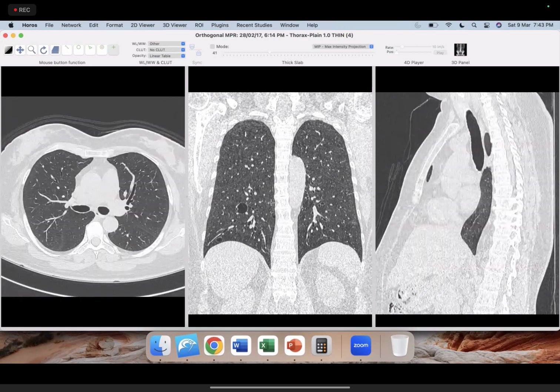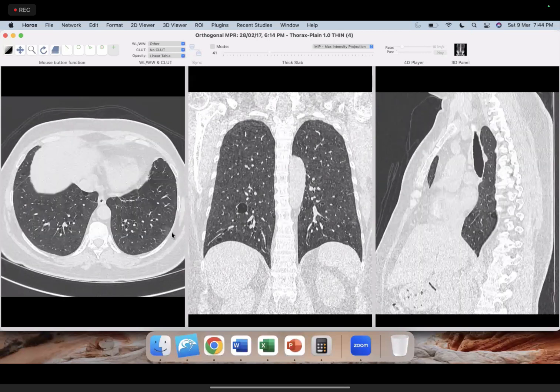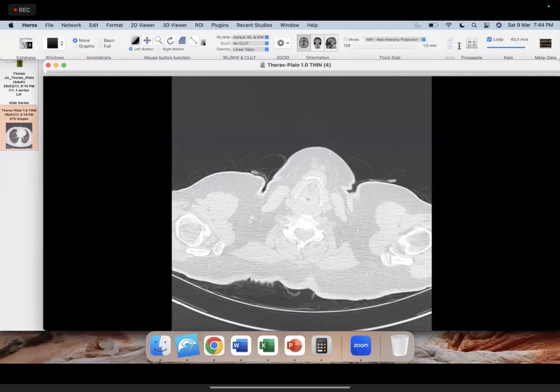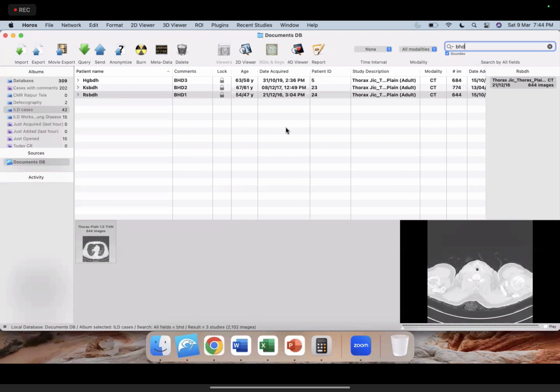But remember, to differentiate from LAM, the intervening lung parenchyma is not normal. There will be some ground glass, typically like this, and typically you then ask for these underlying conditions also. And just to complete the spectrum, I think I should show this also.